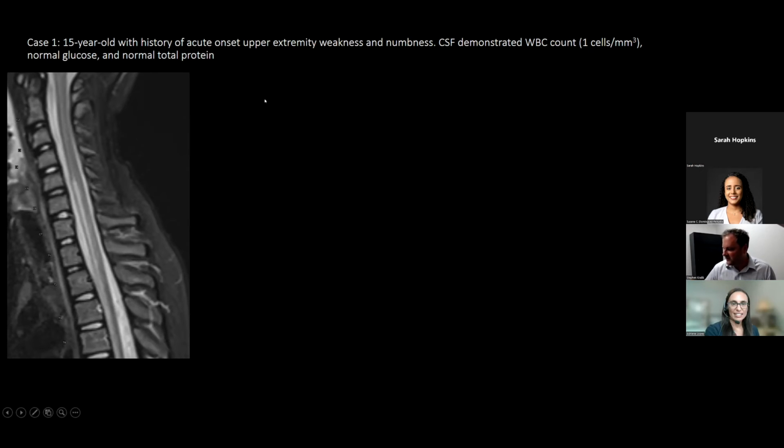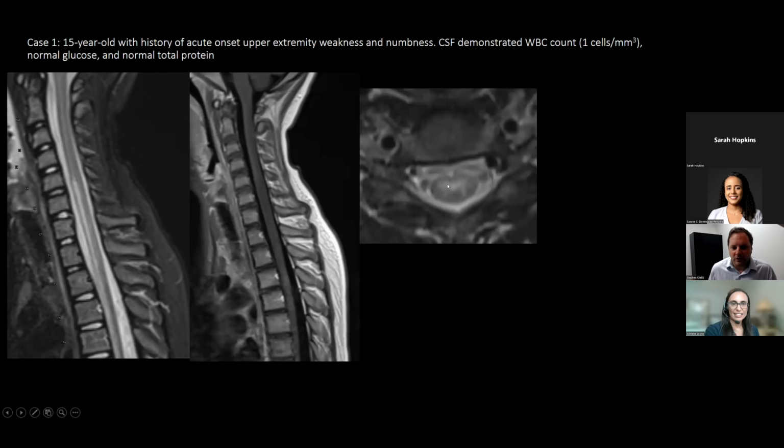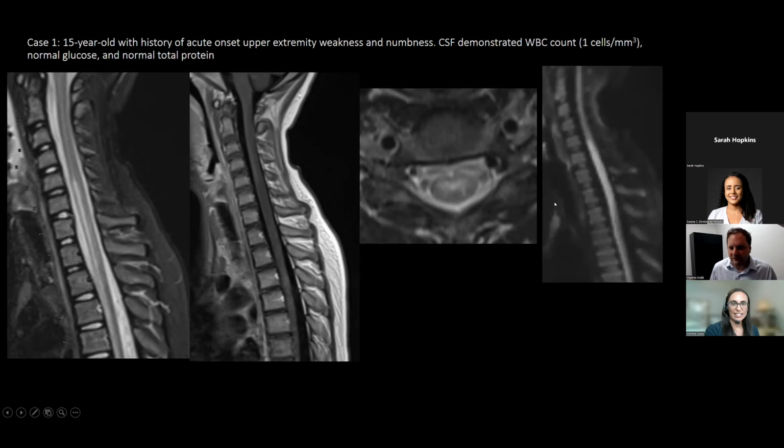And so what we see is that we have again a longitudinally extensive T2 hyperintense signal from the cervical to upper thoracic cord. So that looks like our AFM I showed you, very pencil-like and sharp. We go to our post-contrast imaging, there's no enhancement that we're seeing. We go to our cross-section T2, looks really good for that butterfly-like pattern. So we're thinking, okay, feeling good about AFM.